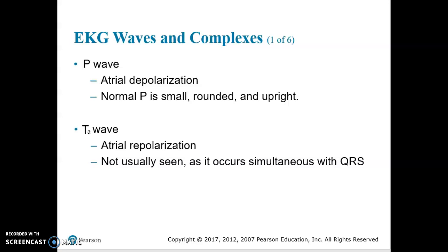Chapter 2, Video 3. Today we're going to talk about the EKG wave complexes and what each component of the EKG strip represents. That's very important, and I think the things that we discussed in the previous lectures will make sense to you, knowing what exactly it is you're looking at.